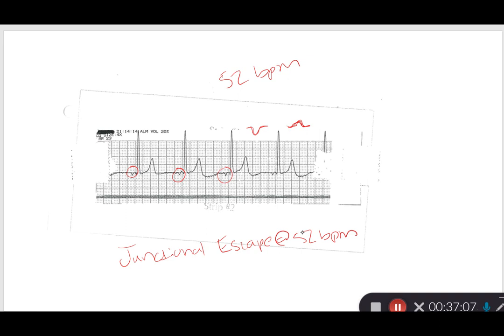But when I look at this, my QRS ends right here, and that's right on the isoelectric line. So there's no ST segment elevation. I just have a very tall pointed T wave, which is commonly seen in electrolyte imbalances like high potassium. So that is not something that we need to put in the name. It's definitely something you want to note for your treatment.